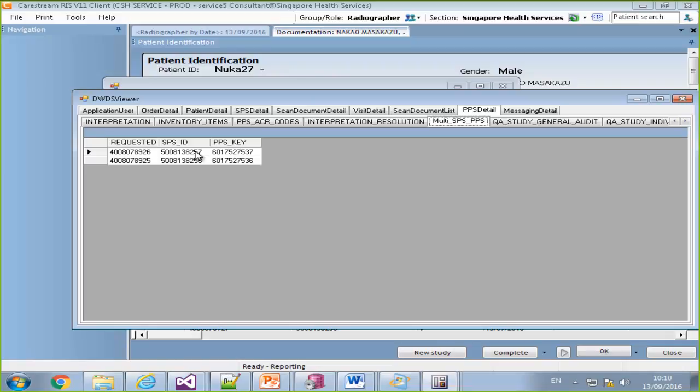Generally, they're registered against a single procedure. Most of the rest, unless they're system-type fields, the data is copied.